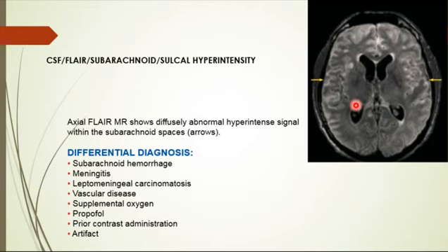So there are various conditions affecting the leptomeninges, CSF, and vasculature that can lead to inadequate nulling or deletion of the subarachnoid signal, what's called FLAIR hyperintensity sign. The causes, like we said, as the differential diagnosis here: various artifacts, including motion, pulsation, susceptibility artifact.